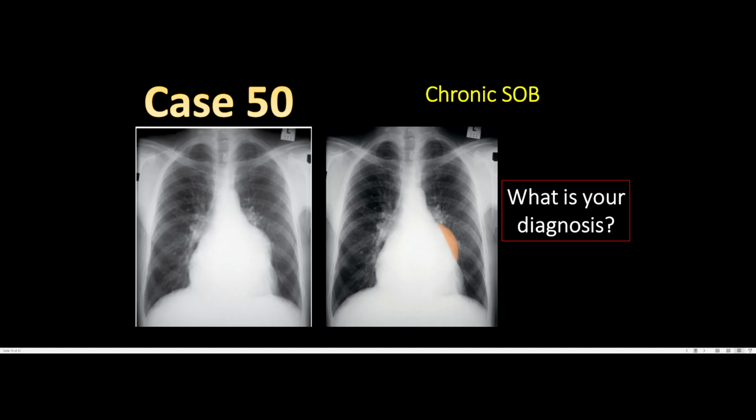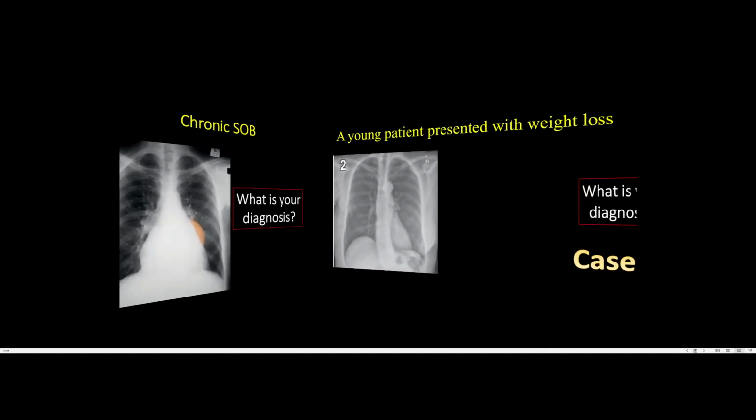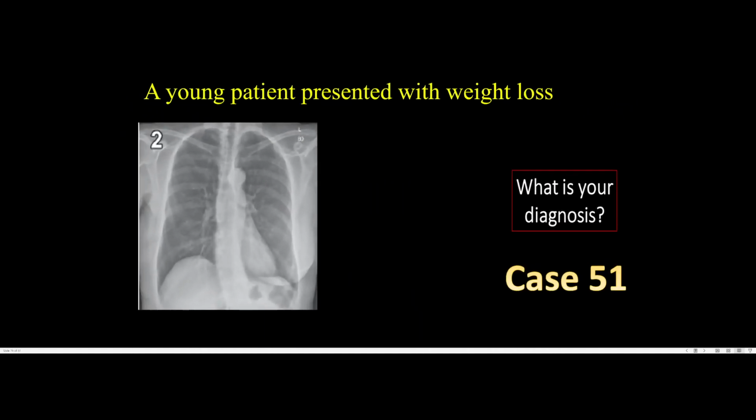So again, the positive finding here is left atrial enlargement, only this one. Everything else is normal, and this might have a number of differential diagnoses as to why. So this is not hypertrophy, this is enlargement.